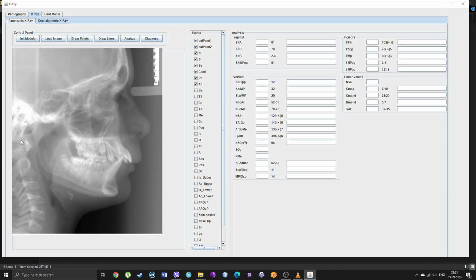Articulare, let's say it's here, I think. Yes, it should be here. Now T1, T1, T2 here. Okay, let's try this here. Let's go with this side. Bear with me here. This is just presentation.